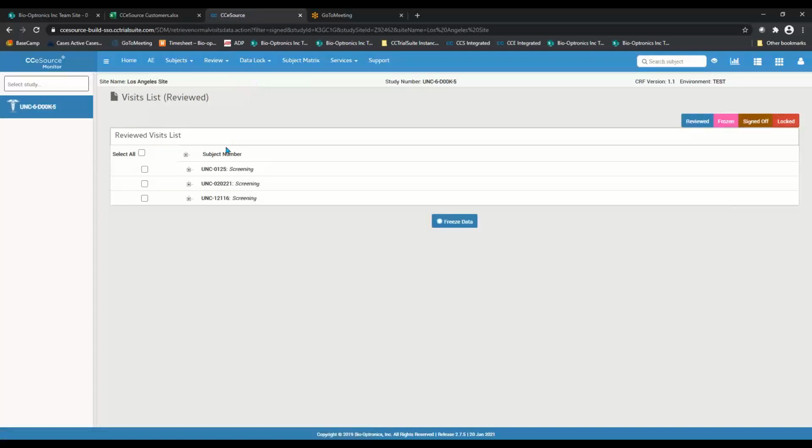The nice thing about this is when we're freezing patients. So when we froze that from the checklist, we could enter the signature there and we had to validate our credentials. This is the one place where the bulk review may come in handy, is the freezing.